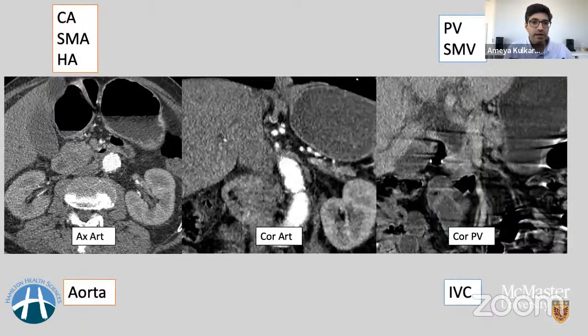Once we do that, we'll again go by our algorithm. Is there any tumor at these major vessels, celiac axis, SMA, or hepatic artery? Look at this, everything is clear. I know that this is not one of the nicest images, but I'll just outline the portal vein and the confluence here for you. The tumor is definitely away from that area. And then there is nothing around the aorta, as well as the IVC. We saw that subsequently, even on the MR, there was a nice fat plane between the posterior part of the head of the pancreas and the IVC.